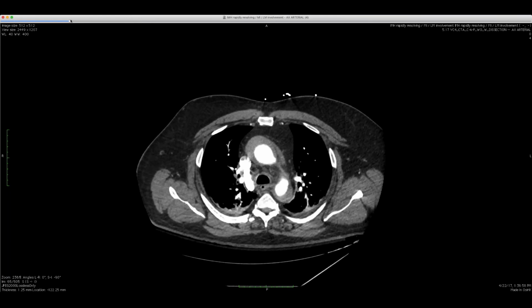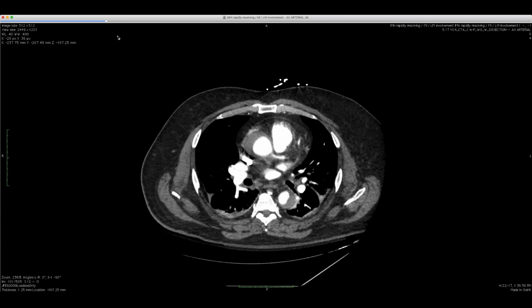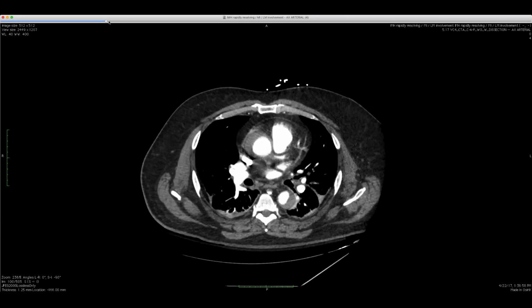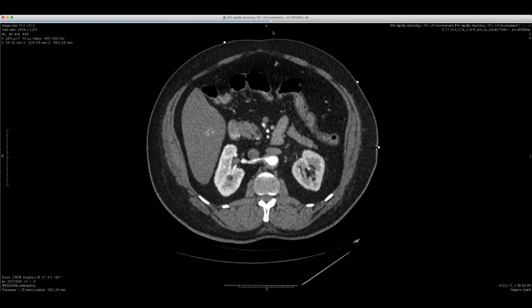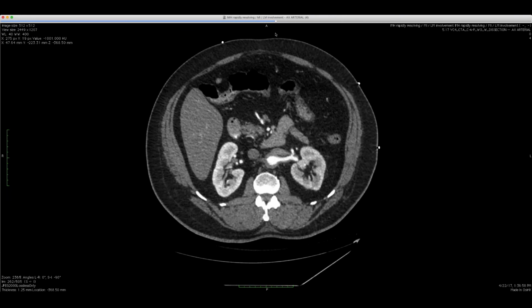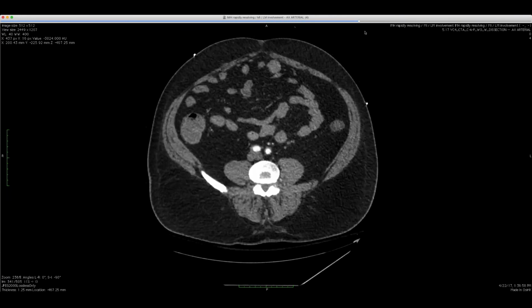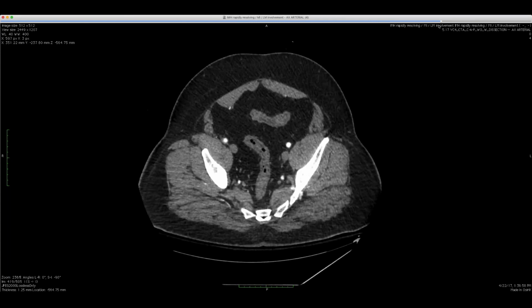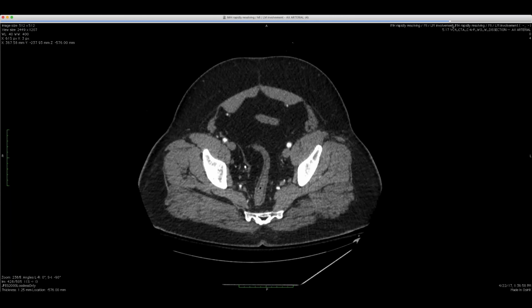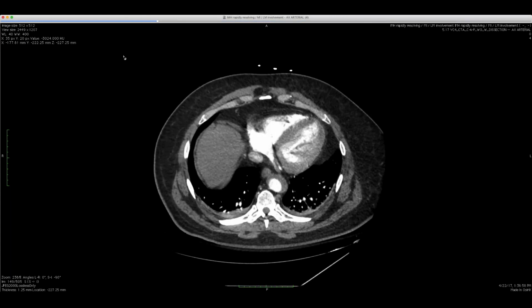You can see that the intimal irregularity is right there. Again, the part of this process that went into the left main has decreased. And let me show you going into the abdomen, this crescentic abnormality has decreased, and the involvement of the renal arteries has decreased. And look down here, the involvement of the external iliacs has decreased, and now they're patent. So very, very odd. Let me show you a couple other things here.